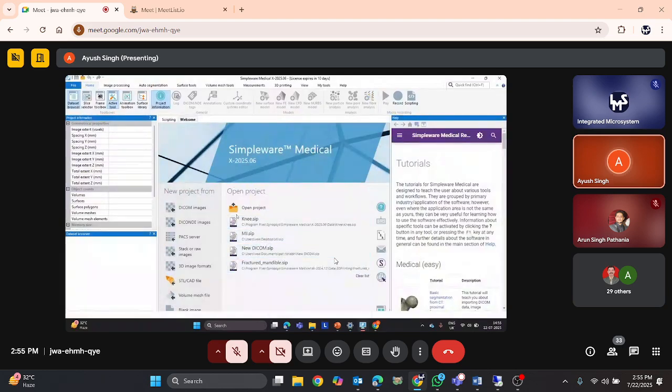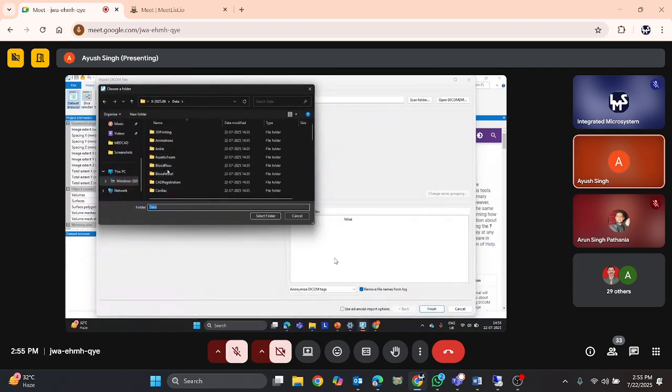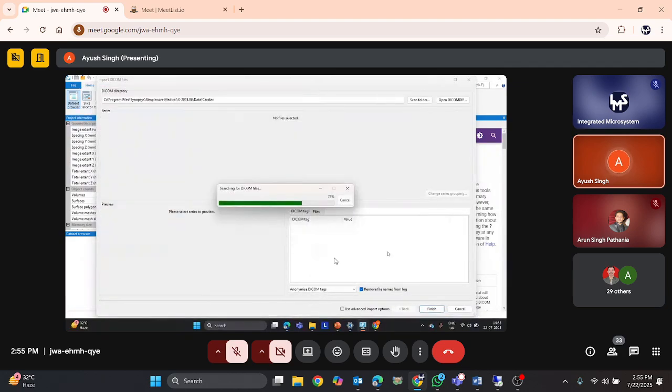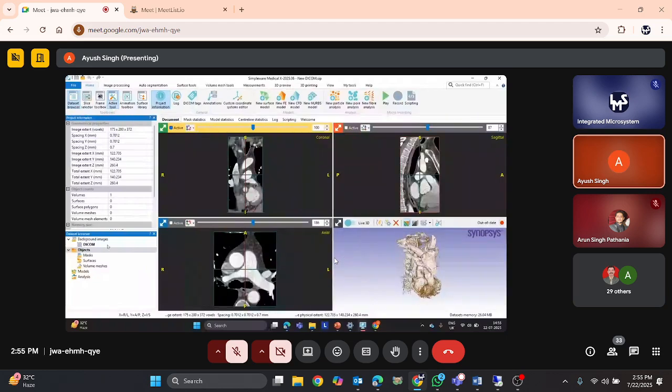Opening this particular window, bringing up the console, selecting the file that I was working with. Yeah. To showcase the change that occurs, one more option that we get is that whenever we right click over here, we'll get multiple options. If we are combining different DICOMs, or need to export it as a DICOM dataset, that can be done. If we need to duplicate the dataset, we'll click on duplicate and it will create a copy of the DICOM.